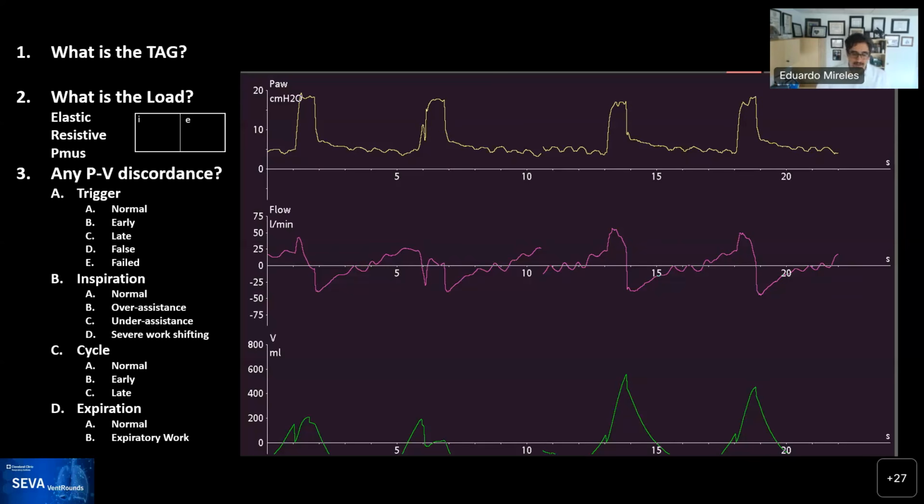And then CMV stands for continuous mandatory ventilation, and mandatory means that all the breaths are mandatory. A mandatory breath means that it's triggered by time, in this case, or by the machine, or cycled by the machine. This ventilator does a little thing in which it will make little triangles appear to tell you that this is a patient trigger. You do not see any of these triangles anywhere, which immediately tells you that these are breaths triggered by the ventilator.